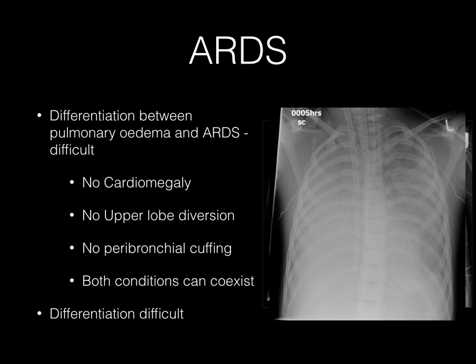There is no shift of mediastinum as evidenced by the ECMO cannula, which stays on the right side of the vertebral column. The endotracheal tube appears to be close to the carina and maybe too far down the trachea. The nasogastric tube is in good position. This may suggest a pattern of either cardiogenic or non-cardiogenic pulmonary edema.